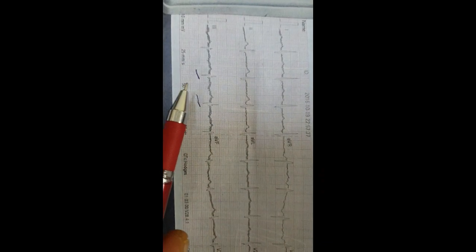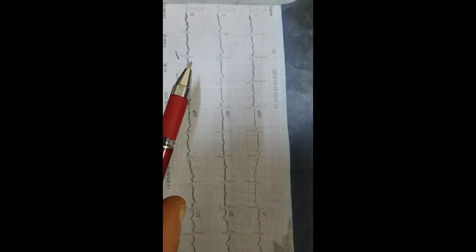This is the EKG, and look here at the inferior lead. This is lead 3. It has a small Q wave and ST segment elevation and T-wave inversion.